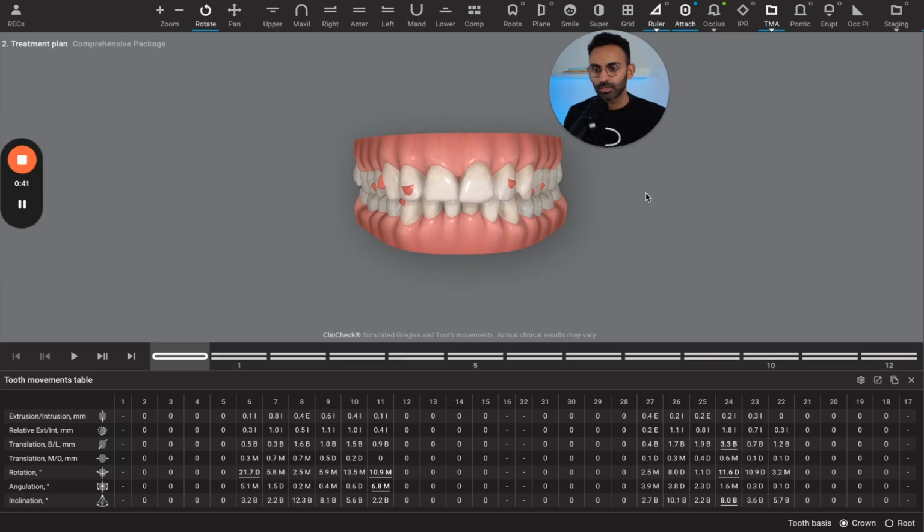I'm Dr. Avi Patel, and I've trained over 200 dentists how to start doing aligners, and this case was shared with me. I want to break this case down and share it with you. Check it out. This one's interesting because it's got a situation where you've got crowding and it seems super predictable, but there's actually a couple modifications that I personally would make to this case to make it even more predictable.